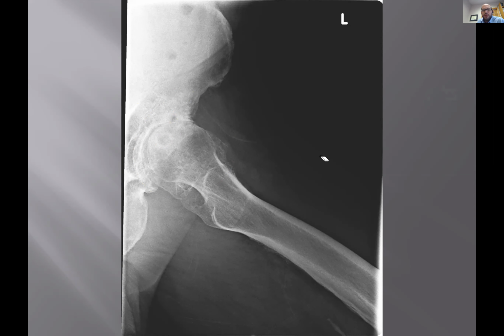Do you see any other findings on this patient? There's calcification in the soft tissue about mid-thigh, medial thigh. Good. Right there, right, Doc? Yep. Okay. So good pickup.